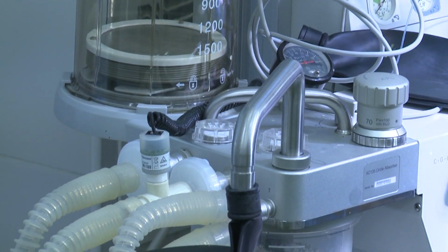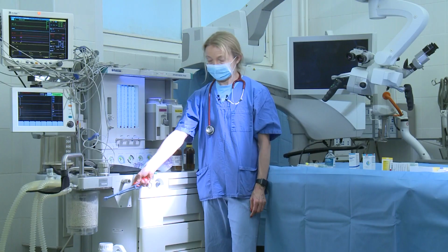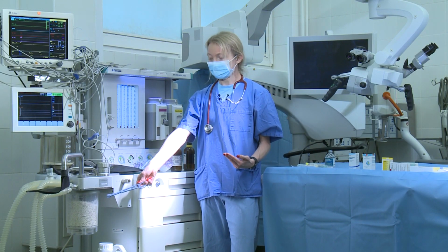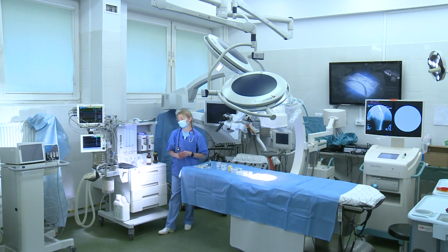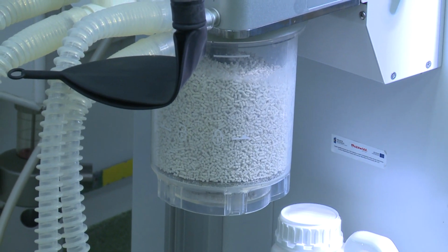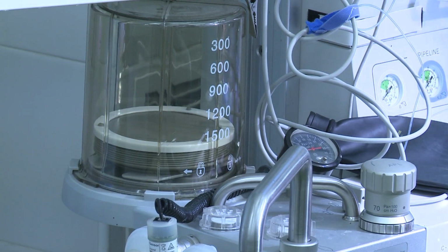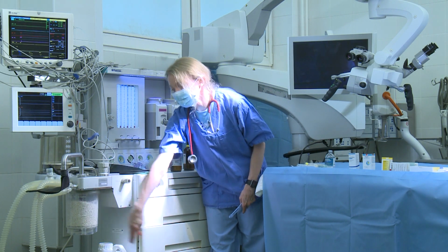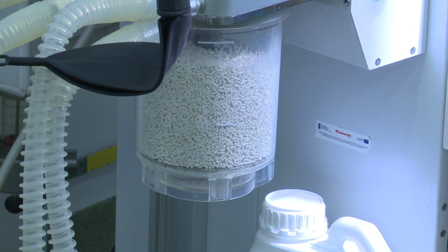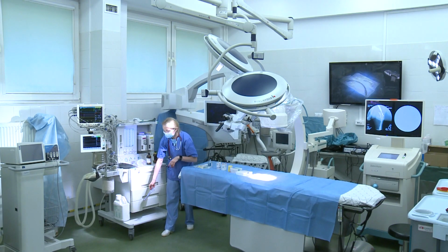We have basic elements inside this system. First of all, it is the carbon dioxide absorber. Where does carbon dioxide come from? It comes from the exhale of our patient. After each exhale, the carbon dioxide occurs inside our circuit, and we don't want to have carbon dioxide in the inhalational flow. That is why we have a carbon dioxide absorber. You know it works when you put your hand onto the absorber, because this is an exothermic type of reaction. Inside the absorber, these lovely crystals we call soda lime.